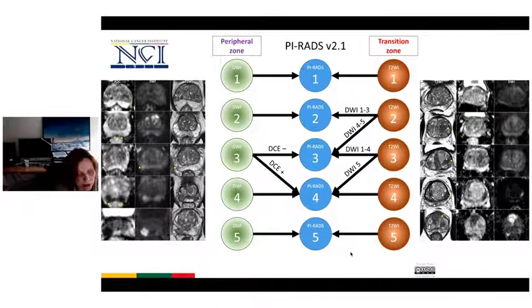And here I present the main schema of PIRADS evaluation, and later I will explain all the signs that we evaluate in both zones.